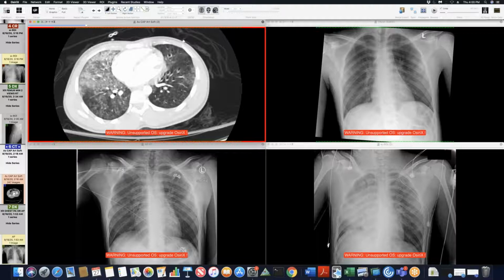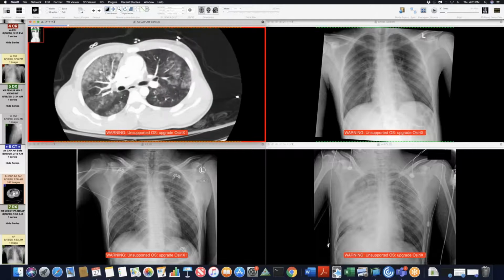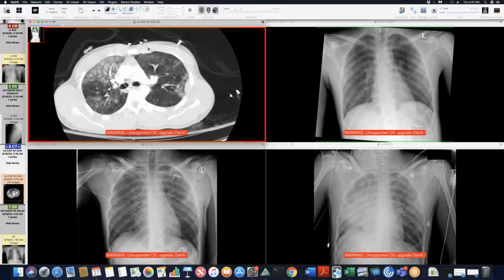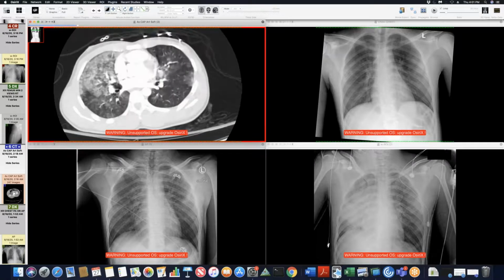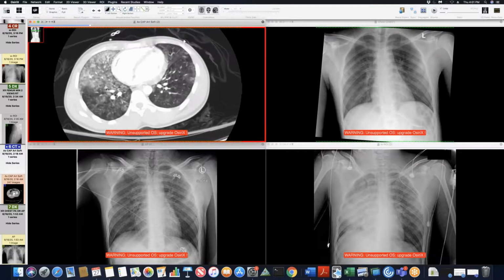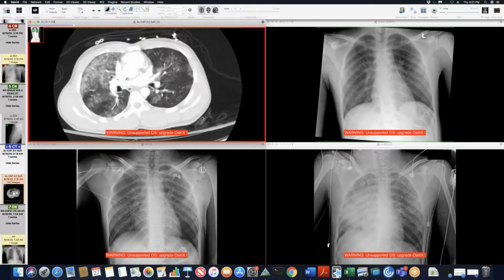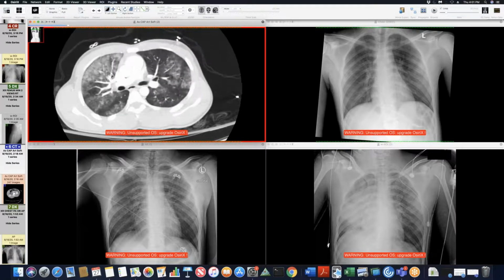Yeah. And usually acute lung injury from fat embolism is symmetric. There's bilateral symmetric lung edema. And this one, there's a lot more abnormality that developed in the right lung. The other thing is, with fat embolism, I usually tend to see it at the lung bases, and I'm not sure if that's just dependent on the positioning, but it looks very similar to acute chest syndrome in sickle cell patients, but it's a little bit more basilar than this. But for me, that's what I thought this was still, regardless.